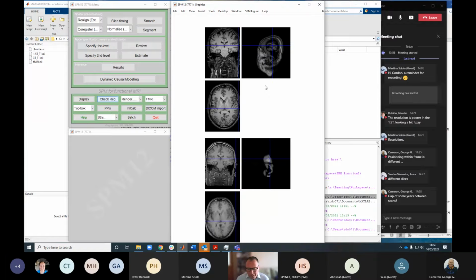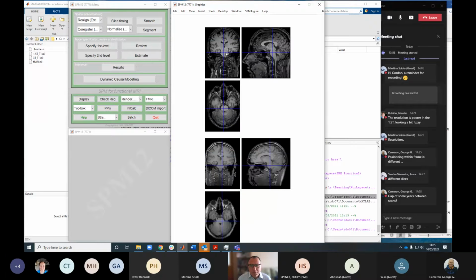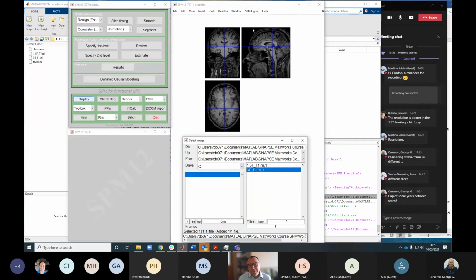So when we're collecting the data, we do really quick snapshots. And so if we have a look at this structural scan, the one at the top here, at 3 Tesla, it's a really nice picture. There's lots and lots of contrast, lots of high resolution. Each little voxel here is about 1 millimeter cubed. Let me display a functional image. So what I should say before I do that is that this image takes about 5 or 6 minutes to collect.